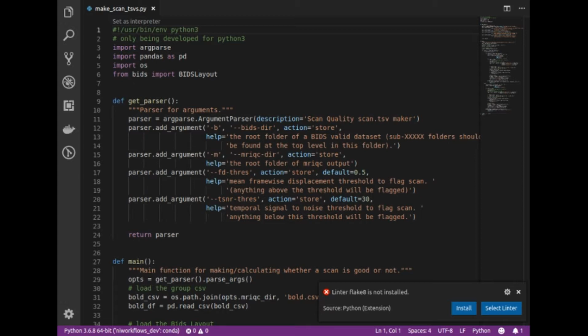I don't remember if there's anything else in document. I think I need anything for that. What else do I need to change? Don't need to change any of the interfaces. And I'm guessing I'm gonna make some more changes to get that functionality where it gives a warning in case the algorithm selected more volumes than what was specified.